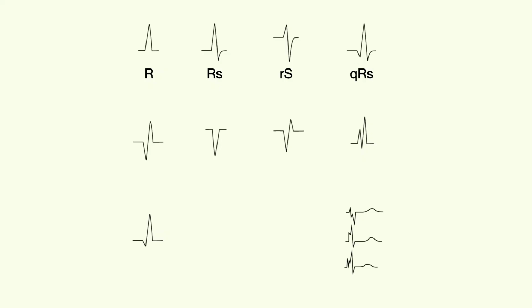That's QRS. Here's a QR. This one, although it's a Q wave, people will also say QS complex. You don't know for sure if it's the beginning negative deflection or the end negative deflection because there's no positive deflection separating them. So it's just a QS complex. And then what do we call that one right there, that kind of funky looking one? That's right, this is an RSR prime because you have a positive deflection, then it's negative, then a second positive deflection.